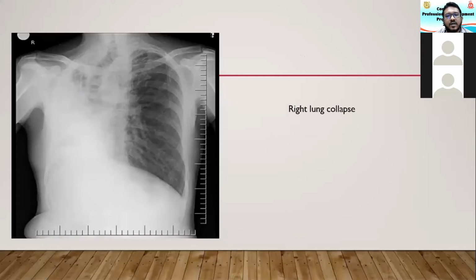There's a large lung collapse on the right side with compensatory hyperinflation, and you can see the flattening of the left diaphragm. That is because, to maintain the oxygenation, people try to overcompensate and hyperinflate on the normal side. And even if you see this in an adult, you have to think of a tumor always, and if it is in a child, you have to think of a foreign body or mucus plugging also can have the same effect.